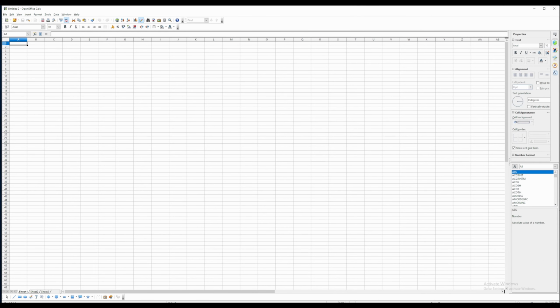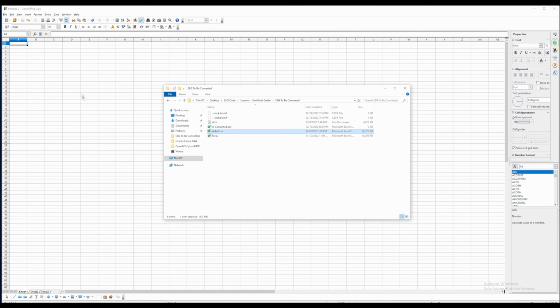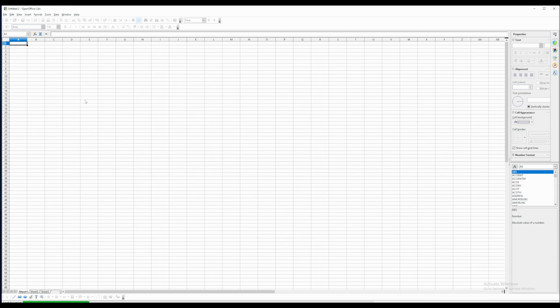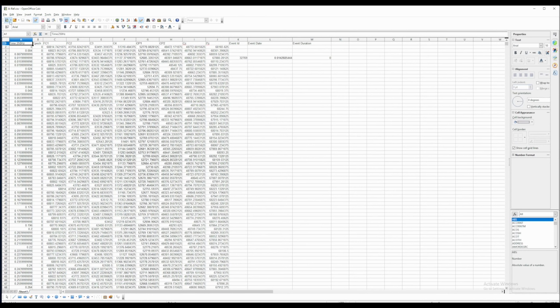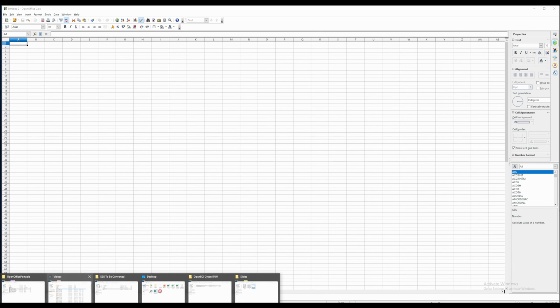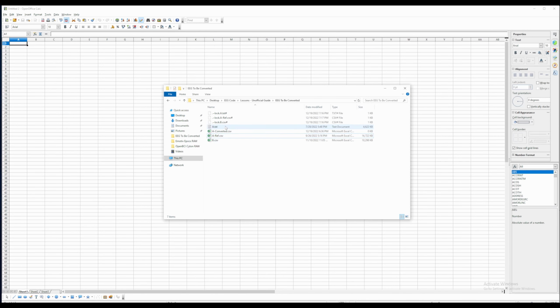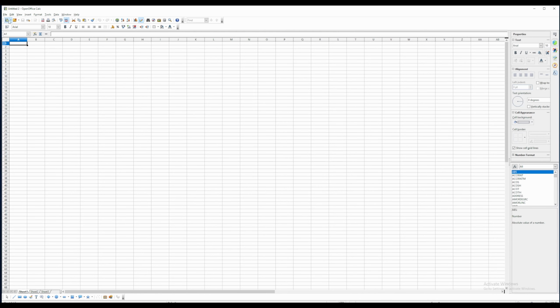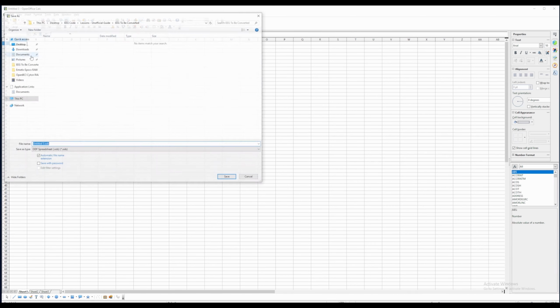And we have our reference for A, which was through OpenBCI. And we also had an empty file. We can just start with this. So we created this CSV file, which is an empty text file. We can open this, or we can just open an empty file like this and save it as our file.